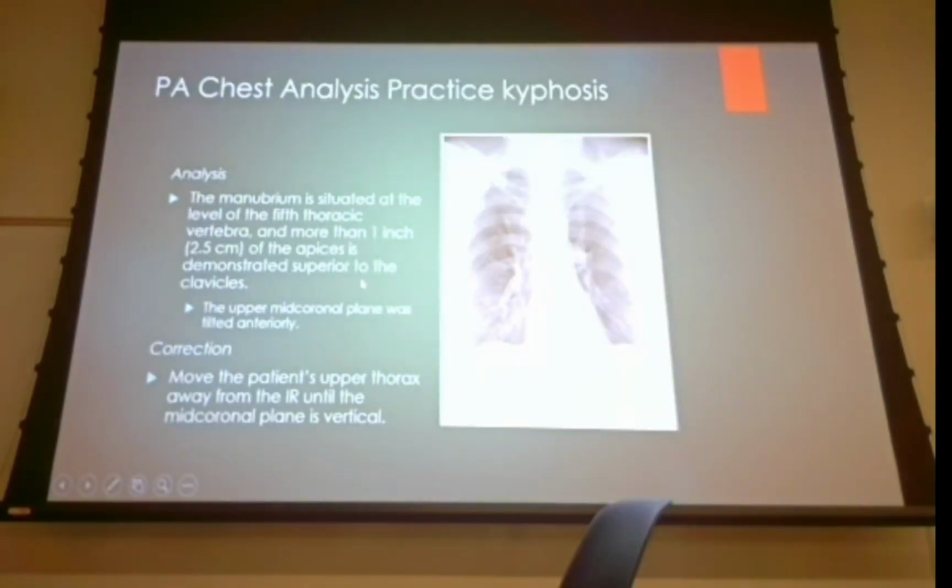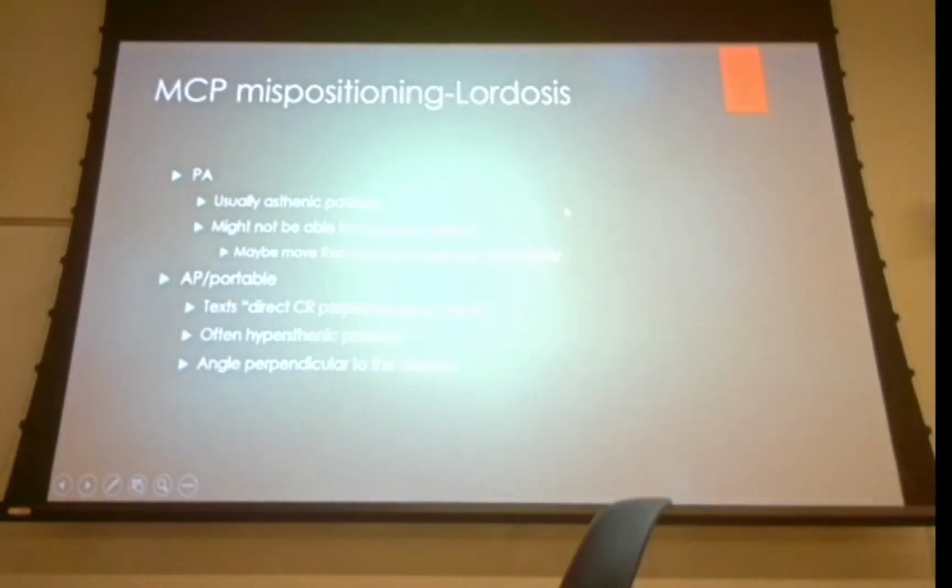So just know the difference between those. Both can give you that V shape, but again, what you're going to look at is the medial end of the clavicle and make sure it's not in a bad place.